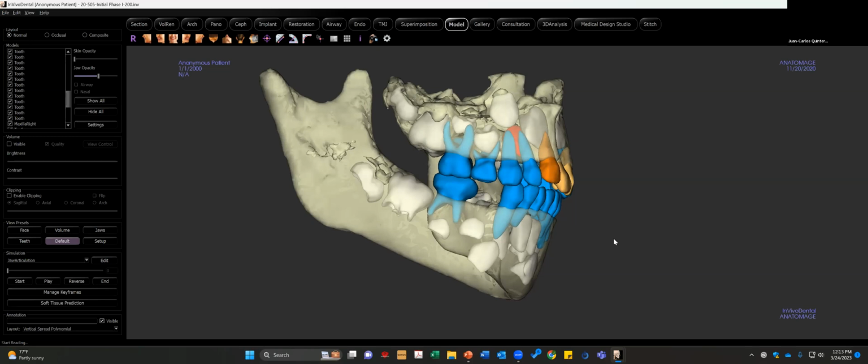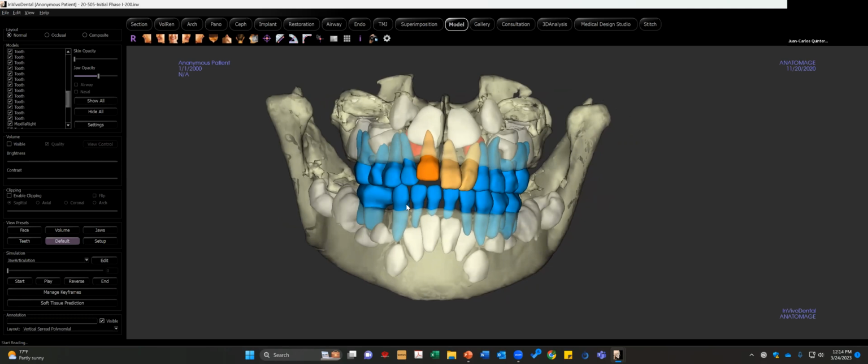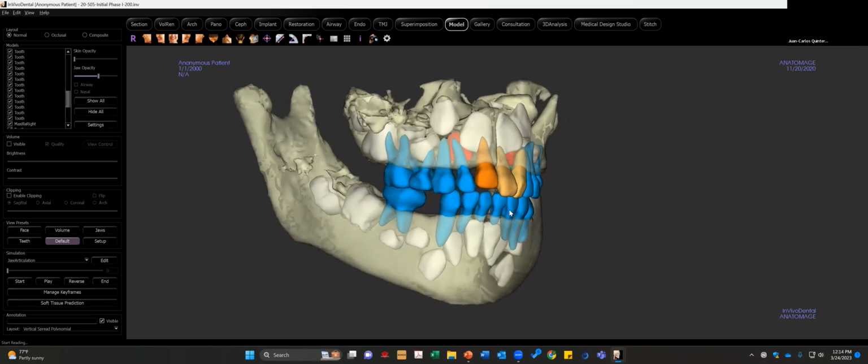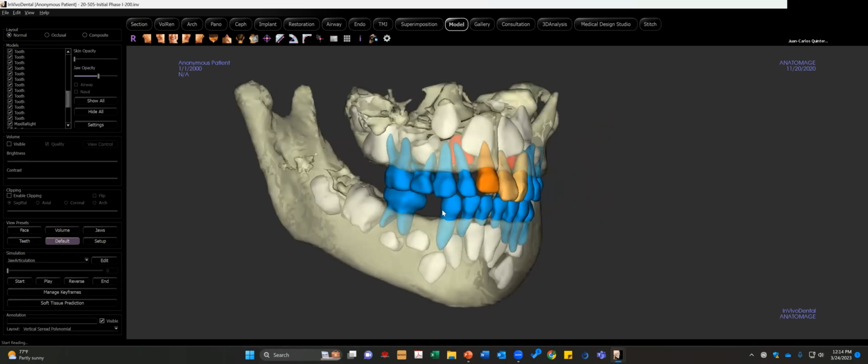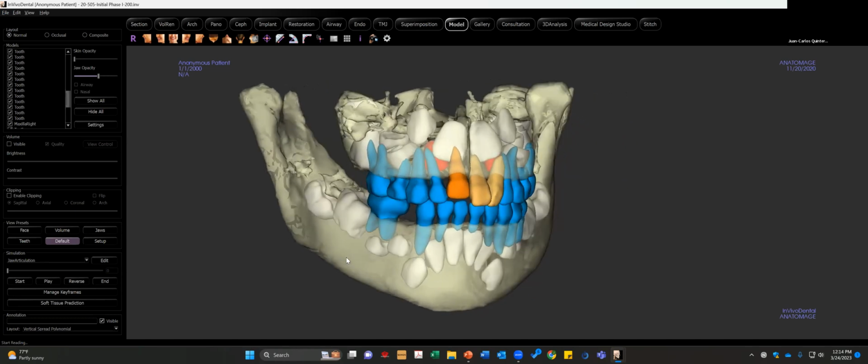This is one step up, or maybe 1,000 steps up from that. Okay, so this is what the Invivo model product is, exactly what you're seeing. It's a 3D functional dynamic model that you can use to really see, and to see is to know, and to know is to understand, right?